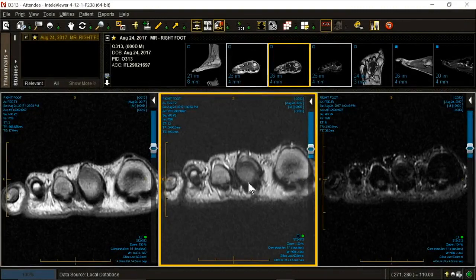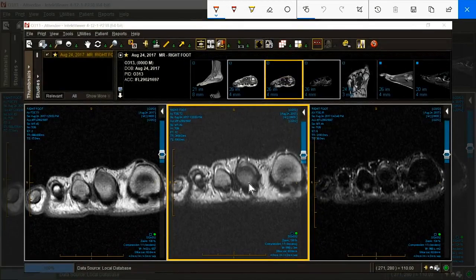Now, when do you actually say Morton's neuroma, remembering that it is not a true neuroma? It's not a neurilemmoma, it's not a schwannoma, it's not a neurofibroma, it's scar tissue with a disorganized nerve. When it makes a shape of 6 millimeters or greater, and it's round, or it makes a shape of 6 millimeters or greater, and it looks like a peanut, like this one, then you can call it a Morton's neuroma. What's the most common location? 2, 3, 3, 4.